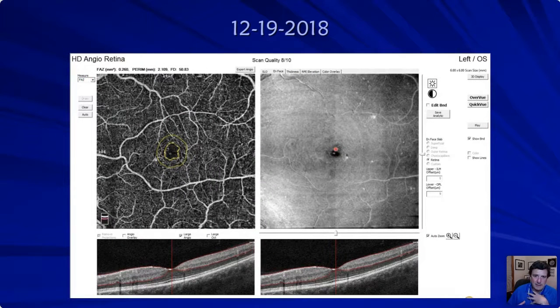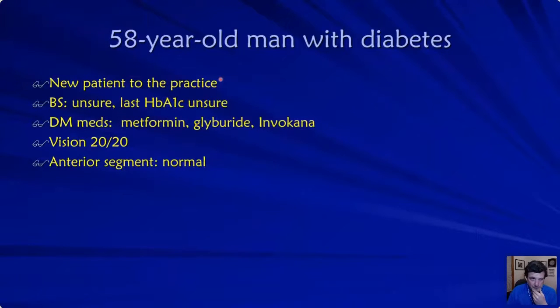And that's what I used to look at angiographies all the time. When it first came out, I thought it was going to be like Rocky Road ice cream. And it was okay, but it didn't have these measuring tools. Once they got these measuring tools, then it was awesome. You can then follow patients and see how their foveal avascular zone is doing. Is it distorted or not distorted?